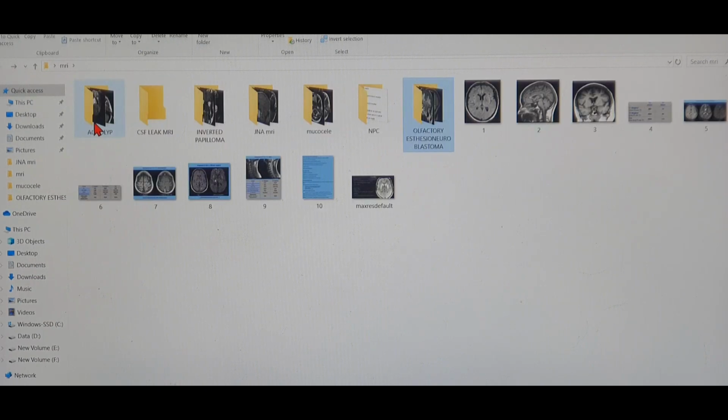So moving on, we know that the AC polyp has similar features, such as the mucosal peripheral enhancement and all that. CSF leak, I spoke about the MR cisternography and the various complications of using gadolinium, though it's the safest drug to be used, but if used in excess amount, it can have a huge complication.